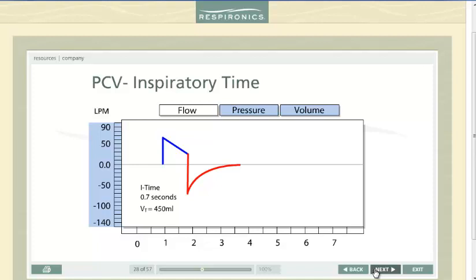If you answered increase the driving pressure, that is one way of increasing tidal volume. Before increasing driving pressure to obtain additional tidal volume, consider increasing the inspiratory time. As illustrated here, inspiratory flow does not return to zero before cycling into exhalation. This can result in potential lost tidal volume as indicated by the green arrow. Increasing inspiratory time allows the flow to return to baseline and enhance delivered tidal volume without increasing driving pressure. By increasing inspiratory time to 1.2 seconds, inspiratory flow returns to baseline and the 500 milliliter tidal volume is achieved.